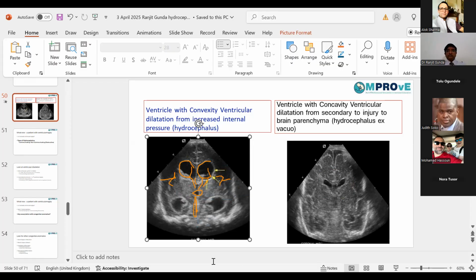You can see the fourth ventricle only in the sagittal views, well, midline sagittal view, and then really in the mastoid view that you saw Dr. Hassoun show it today. But the best other view in which you can see the ventricular system with lateral ventricles, third ventricle communicating with the fourth ventricle is actually going to the temporal and mastoid views and trying to get a linear image. I will talk about it in mastoid views. Any other question?